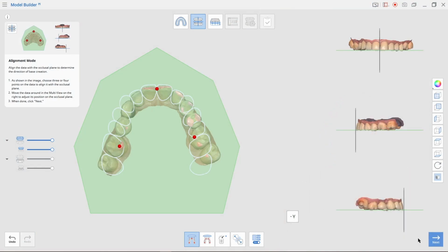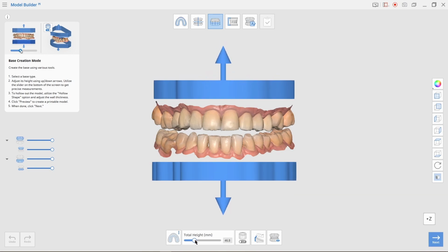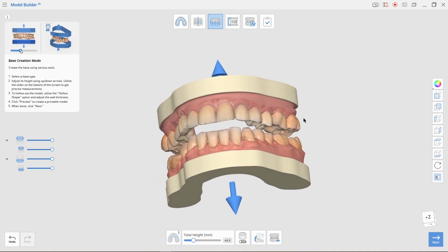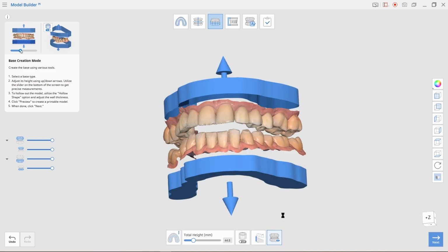Now we're going to go ahead and hit the next icon, and here's our model thickness. You can slide this in or out. Because I'm labeling it with text, we're going to leave it thick. If you aren't, you can leave it thin. There is an option here to make it straight or curved. The default is the curved appearance, where the base kind of curves outward like that. It's a more elegant classic appearance. If you want something more minimalist, click this icon to get the straight, and that will give you something that looks straight up extruded.